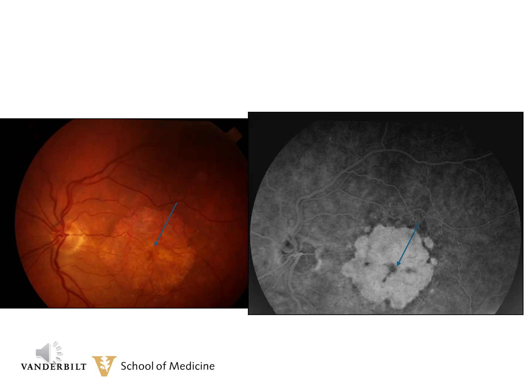Here is another example of geographic atrophy. Note how the hyperfluorescence exactly matches the area of the loss of the RPE. The borders of the hyperfluorescence match the borders of the loss of the pigment epithelium, even down to the tiny area of intact RPE in the center, which blocks dye as it should. The blue arrow on the color photograph points to the small area, and as it does on the fluorescein angiogram. You will see many clinical variations of geographic atrophy, but the general transmission defect rule will hold for all cases.